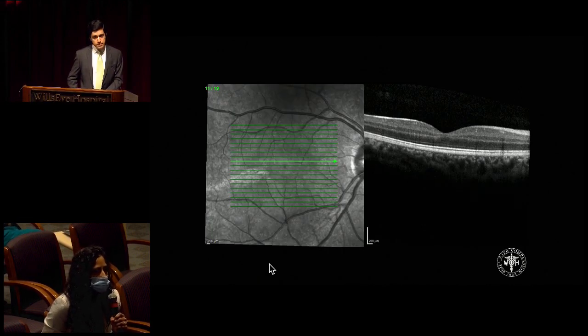And then horizontal OCT cut through the right eye. Sorry, on the infrared image, you see redemonstration of this oval hypopigmented lesion. And then, again, vitreous looks clear. Nerve fiber layer looks normal. Inner and outer retinal laminations are intact. Choroid looks normal.